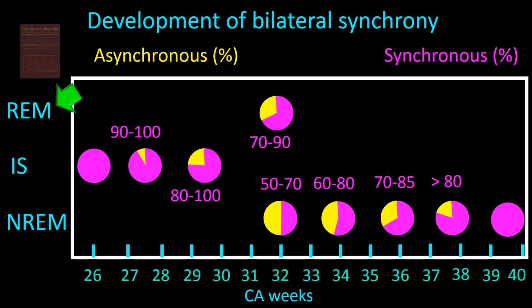During REM or active sleep, during intermediate sleep, and during non-REM sleep or quiet sleep. As you can see, at 26 weeks, during indeterminate sleep, there is 100% synchrony.